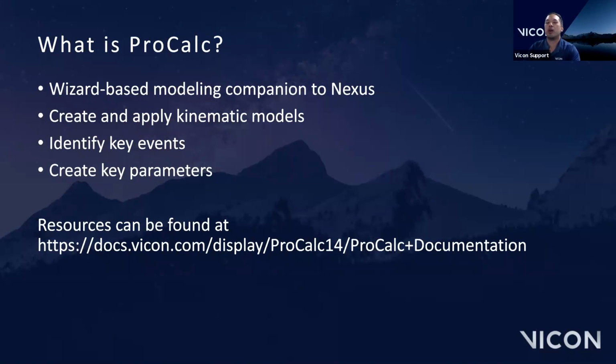So let's say you're looking for the midpoint between 2 markers. It'll say, okay, well, we need 2 points. You just need to click on the screen what it is. It doesn't say, okay, well, you gotta read this manual, learn all the scripts, and then do it. It'll prompt you to choose the right inputs.